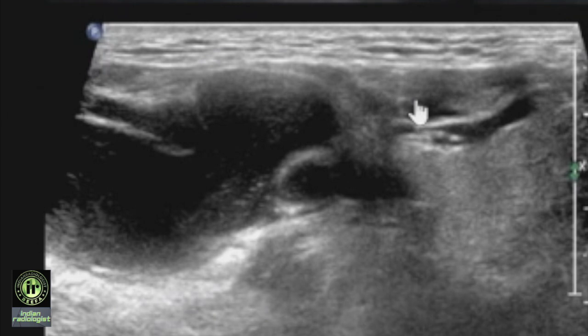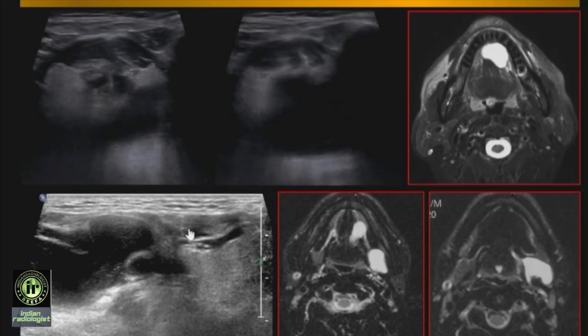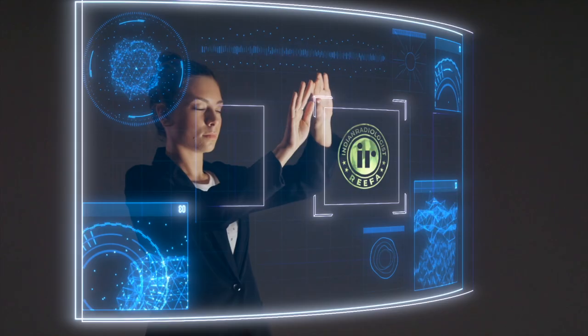By its anatomical definition, I know that this is going to be a diving ranula or a plunging ranula, and an MR confirms both, the ranula on top and the diving ranula below. So again, simply based on anatomy, what it does, not what it looks. So what it looks is part 2. Very often you do not even require what it looks because part 1 will tell you the diagnosis.